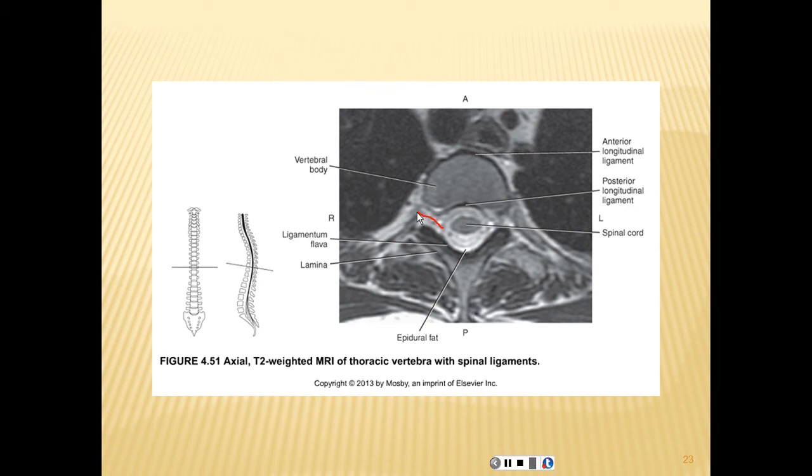intervertebral foramen, where the nerves exit. So when you are performing your examinations, quickly check to make sure that they're present.